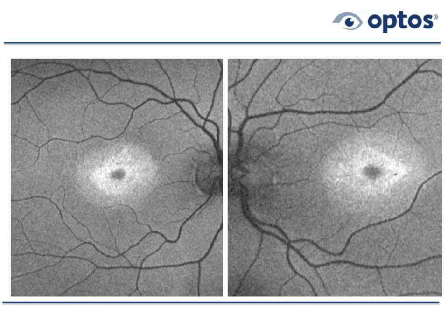We're getting sort of a dark center, and there's a surround to that, and another surround. And some of these bullseye lesions look just like this. Some can look a little bit different. Sometimes we actually get multiple, sort of like concentric circles. But these are bullseye lesions. The center is telling us that maybe it's a little bit darker than it's supposed to be, so there may be some abnormality of the retinal pigment epithelium.